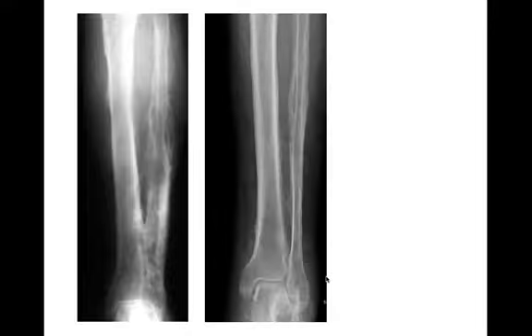Here's a more typical case of periosteal reaction from venous stasis disease. This is a more solid periosteal reaction along the fibular shaft and to a lesser degree along the tibia, both due to venous stasis. The previous one looked a little more bizarre. This one is more typical of a benign or solid appearing periosteal reaction in venous stasis. Can I tell you for sure that this is venous stasis? No, there is a differential for this, but this is one of the more common causes. So this is venous stasis.